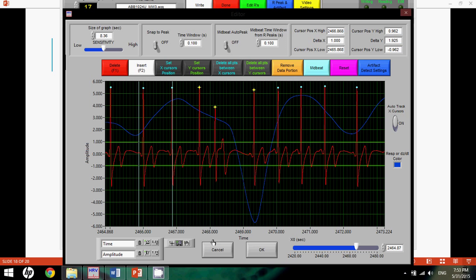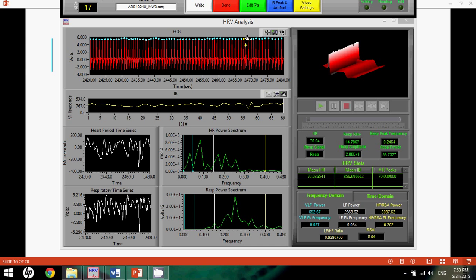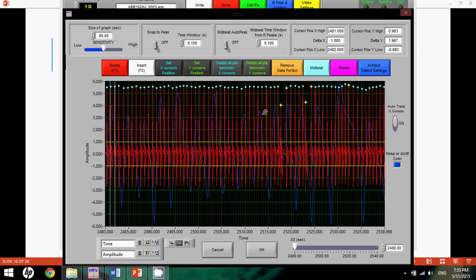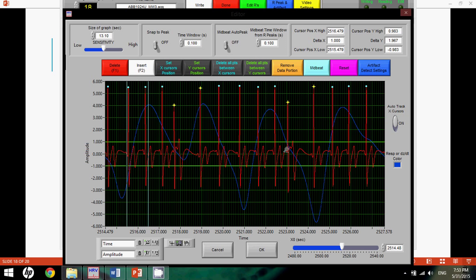In this circumstance, I actually think it makes more sense to let an expert decide whether or not that's real data. In other words, corresponding with Mindware or another expert in the field would probably be the necessary step. It may be the case that these issues are so systematic throughout the data in this particular participant that we may have to exclude the participant altogether. This is just simply a matter of diagnosing what exactly is the cardiovascular mechanism that's causing this. And since neither you nor I have the actual training to do this, it makes sense to just talk to experts.